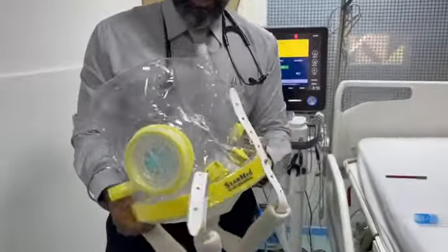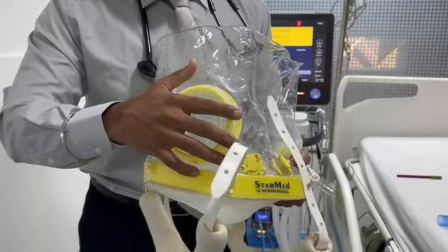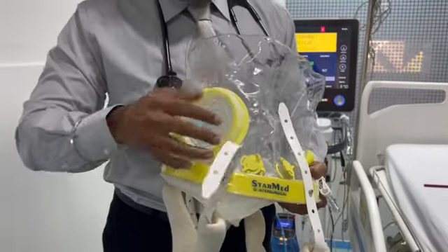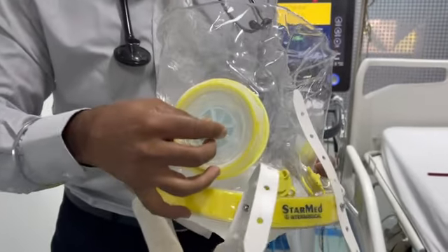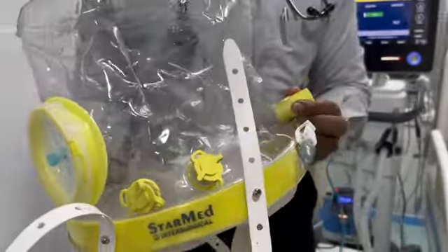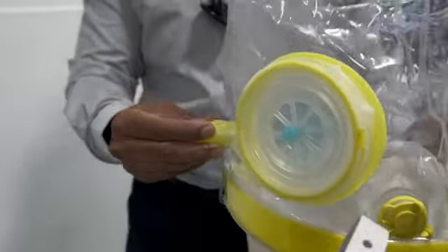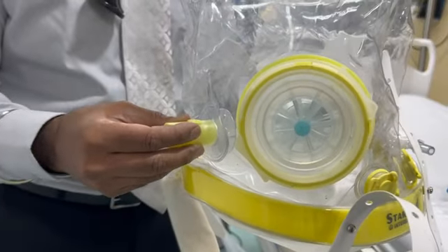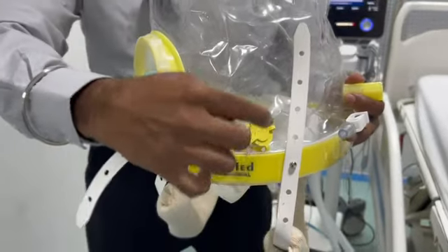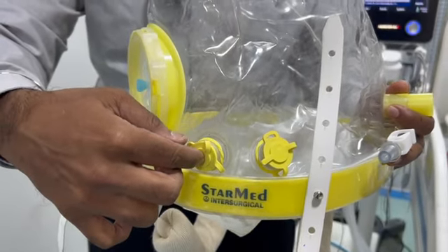Okay, the interface has got a release valve over here, which can release the pressure. So the moment you open this, it will release the pressure completely. It opens up completely. At the same time, it releases some amount of pressure if by any chance the pressure goes very, very high. It's got this one opening here. It's got a second opening here, which are connections required for the ventilator as well as for the high flow. You've got two more openings right in the front over here. One is to bleed oxygen and the other may be used for even drinking purposes for that matter by inserting a straw over here.